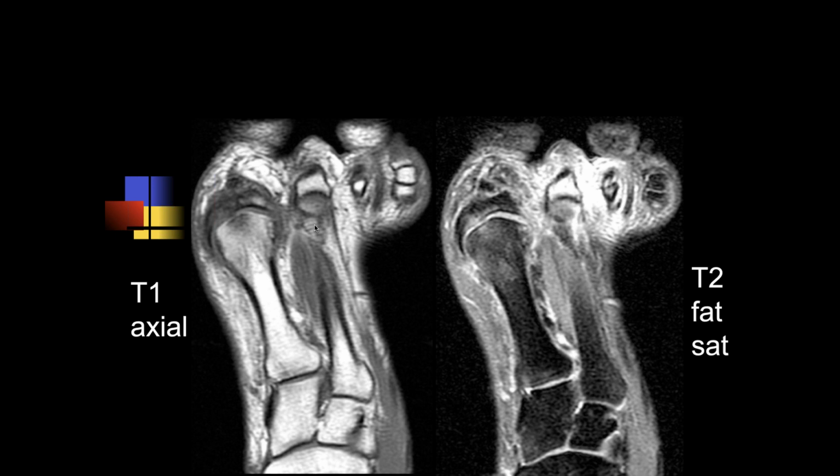Like the soft tissue? Well, you described an abnormal signal intensity within the proximal phalanx of the second ray, and also the adjacent soft tissues. So what's going on there? Well, I guess one thing you worry about, if they're diabetic, is ulceration, but there's no real signal difference in that T1 proximal phalanx. That's important. I don't know, it's contusion, stress reaction, chronic stress reaction, that type of thing. I don't know what I'm seeing.